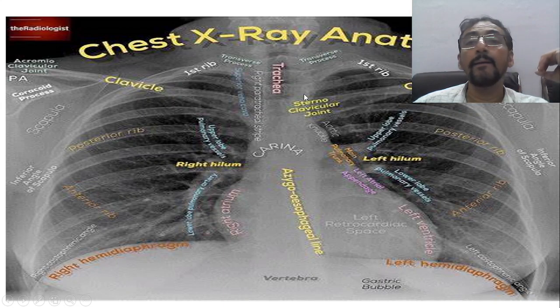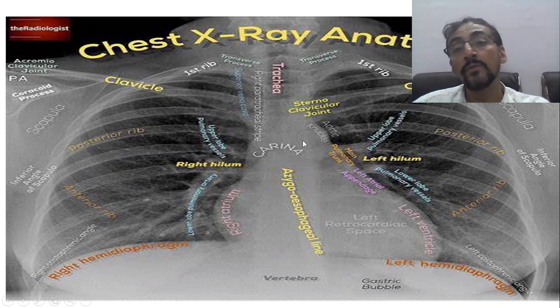Aortic knuckle. Aortic knuckle, very important. See, this is the portion, aortic knuckle वाला portion ये है, ठीक है। यहाँ पे subclavian artery आ गया और उसके बाद ये sternoclavicular joint आ गया, और joint के just बाद aortic knuckle, aortic arch कहाँ पे है वो पता है आपको? वो sternal angle का एकदम उसी लेवल पे रहता है, ठीक है. So now this is aortic knuckle. See, this is a bend, this particular curve which is seen, this is aortic knuckle.